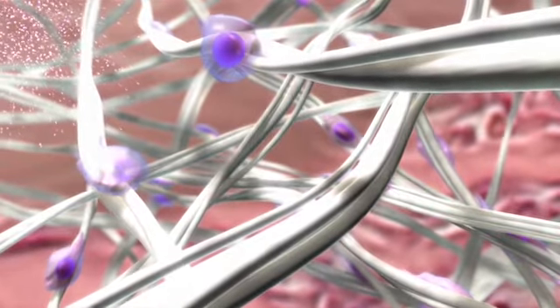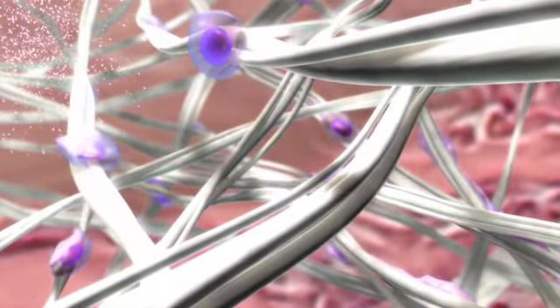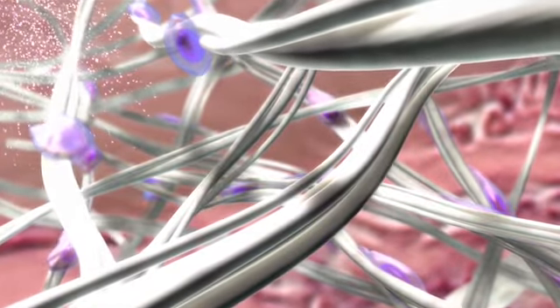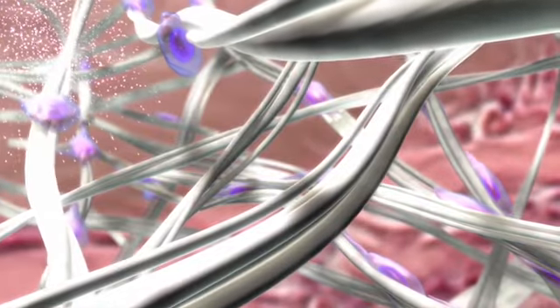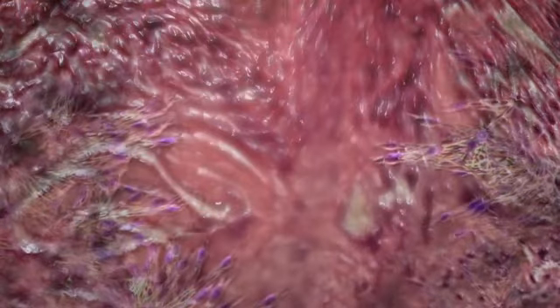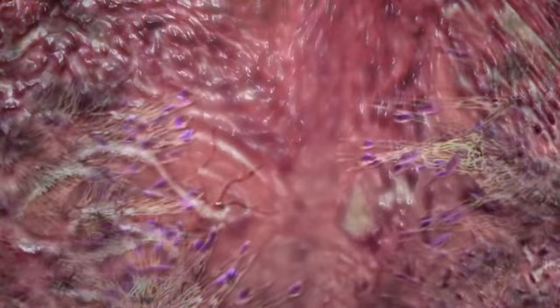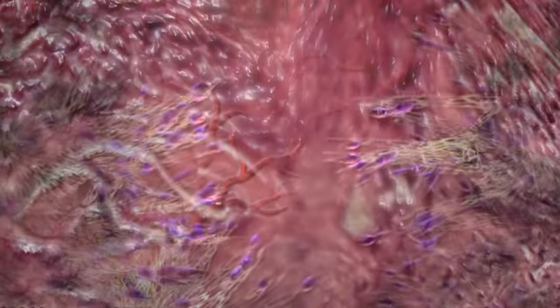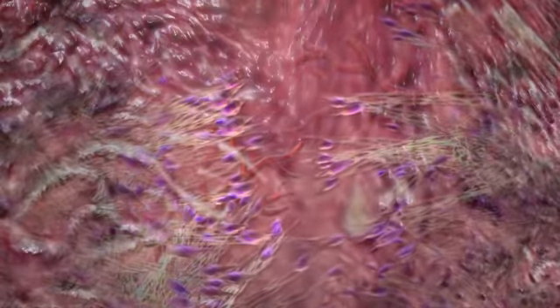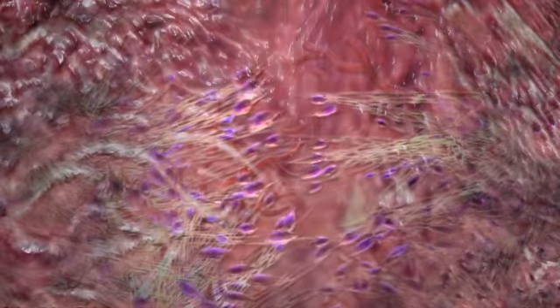This response to cells stretching has been well documented and is clinically used, for example, when tissue expanders are applied to stimulate the formation of new skin. In vitro and in vivo studies conducted using negative pressure have shown that these activities include increased metabolic activity, fibroblast migration, cellular proliferation, and extracellular matrix production.